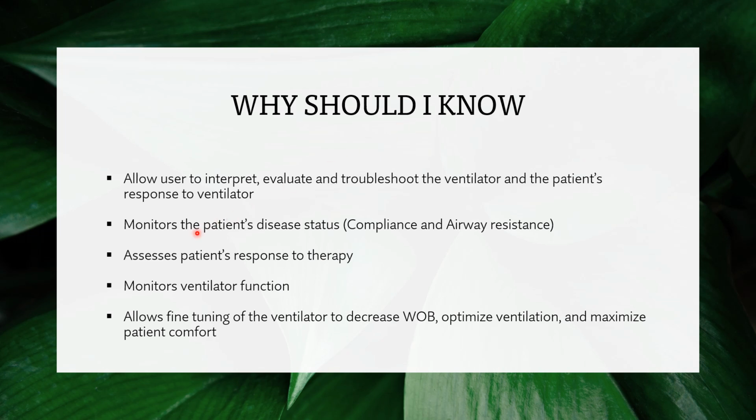It helps in monitoring the patient's disease status, like you can check compliance of the respiratory system and airway resistance. Patient response to therapy can be assessed, and it also allows fine tuning of the ventilator to decrease work of breathing, optimize ventilation and maximize patient comfort.